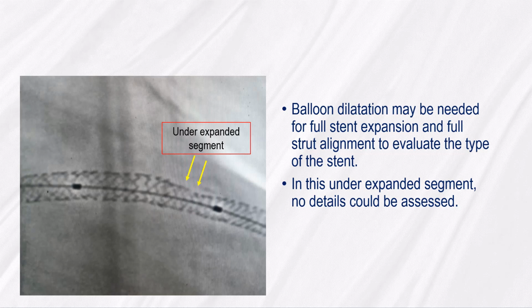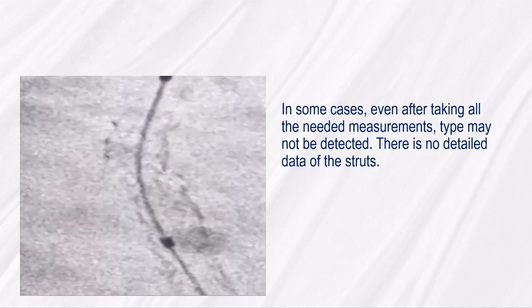In this under-expanded segment, no details could be assessed. In some cases, even after taking all the needed measurements, the type may not be detected. There is no detailed data of the struts.